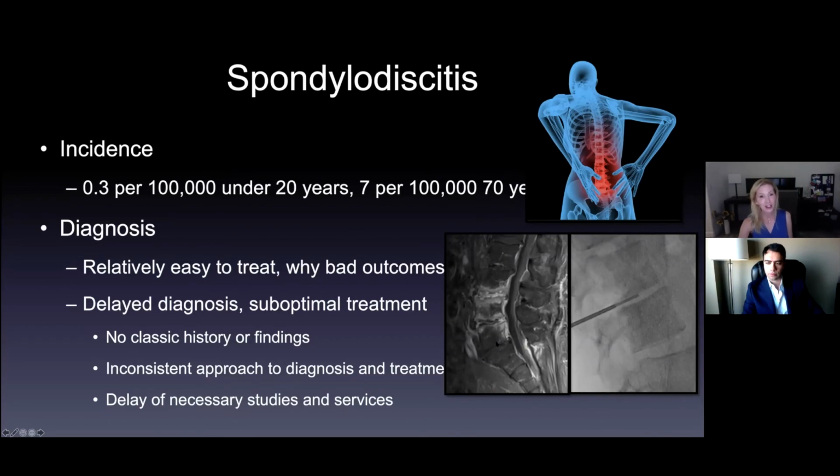This is a sagittal MRI with contrast showing discitis, osteomyelitis, or spondylodiscitis, whatever term you want to use. In this case, it was 3 levels. So this is 5, this is 4, this is 3. We've got abnormal enhancement in the end plates, in the vertebral body, a little bit, especially in this disc, although both levels were infected. And then a little bit, some of this is your epidural venous plexus. You all read about this stuff all the time, so I think you know what it is. But there's a little bit of epidural enhancement infection as well.